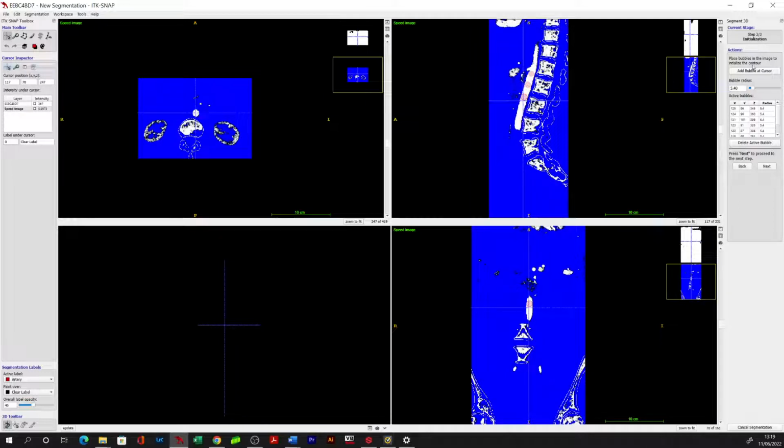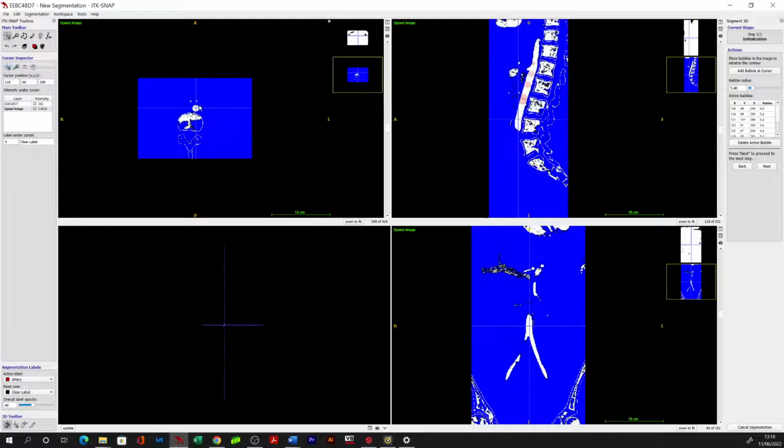And the way the algorithm works is you've basically set parameters which state that you're only interested in voxels which have these Hounsfield intensity characteristics. So when you've got something like an arterial scan where you've got very bright white arterial vessels, it's quite easy to label those as they're well isolated from the surrounding structures, or certainly more so than if you had, say, portovenous imaging.